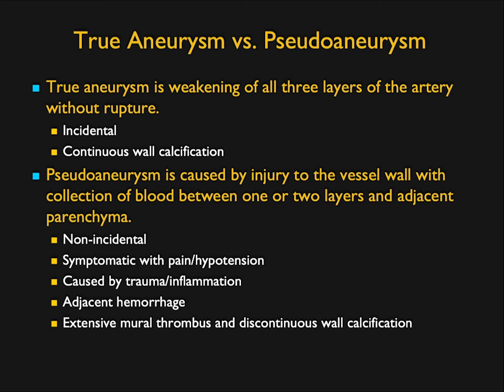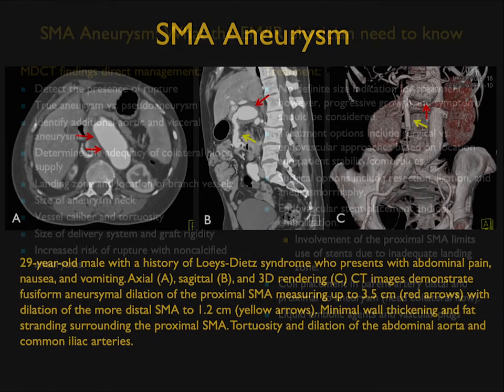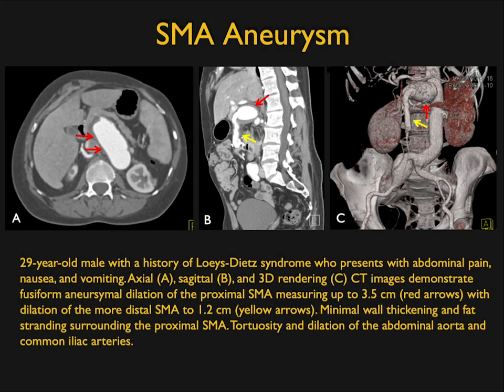for SMA aneurysms, and you recognize that detecting the aneurysm and defining the extent of the aneurysm all becomes very, very critical. We talk about SMA aneurysms being more common now, but they're usually very small, and there's no stenting done in many of the cases. So it really is a challenge and an important diagnosis, but maybe not as critical as some of the other diagnoses. We talk about examples, and here's an SMA aneurysm.